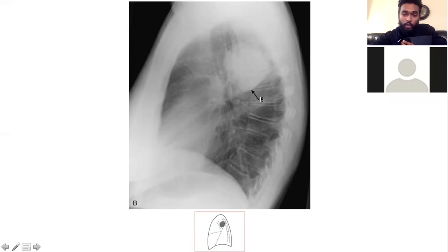And if I draw a line from here to the anterior one third, that's going to be my oblique fissure, and from the hilum straight across, that's going to be my horizontal fissure. So I know this is above both the horizontal fissure and the oblique fissure, like this shows here. So it's definitely upper lobe. You get what I'm saying? If I drew an oblique fissure from T5 to the anterior one third right here, and then I have my horizontal fissure here, if it was like here, then it could be middle lobe. Look at this little diagram here.